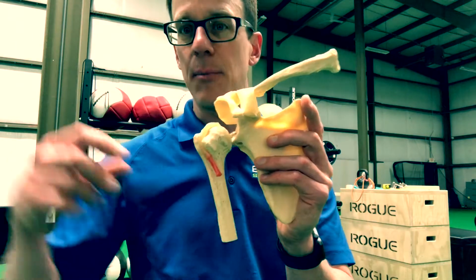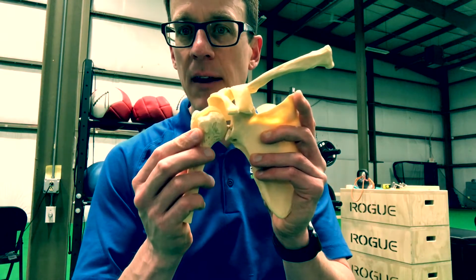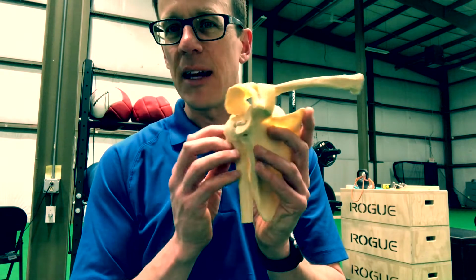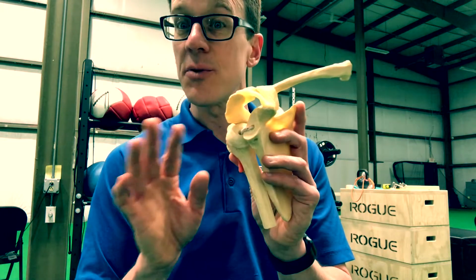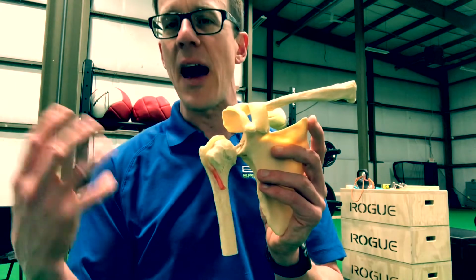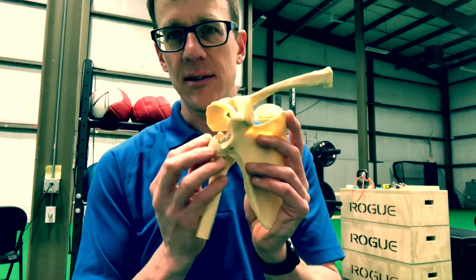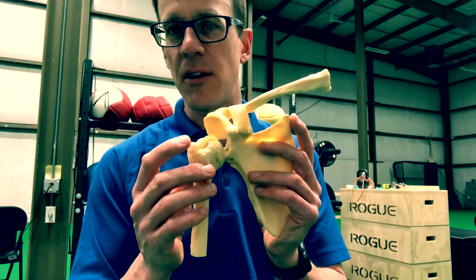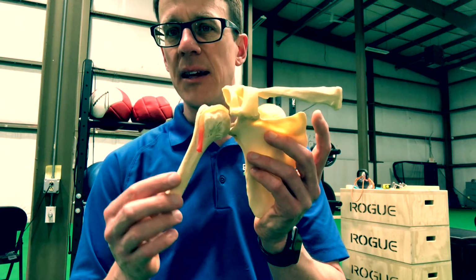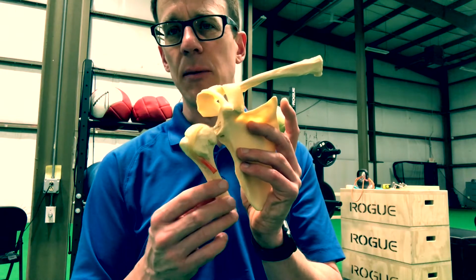So with traumatic problems or overhead activity like pitching, we could have that ball bang around too much into that labrum and tear the labrum. So you'll see some labral injuries on MRI. Those are more difficult to diagnose with an MRI, but you'll also see a more active athlete, and they'll be diagnosed with some labral tears in there. That's another totally different surgery than a rotator cuff. But those are the main findings: the rotator cuff tendon issues, bursa filling with fluid, and also labral injuries.